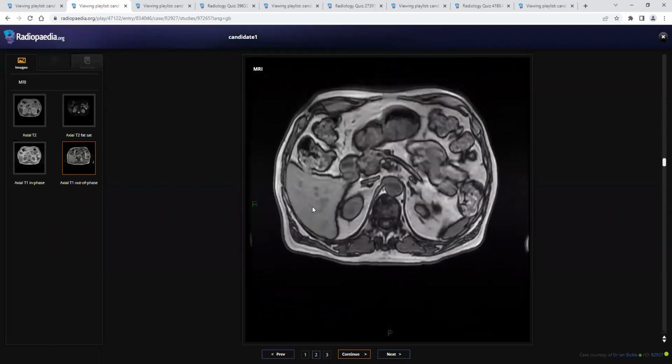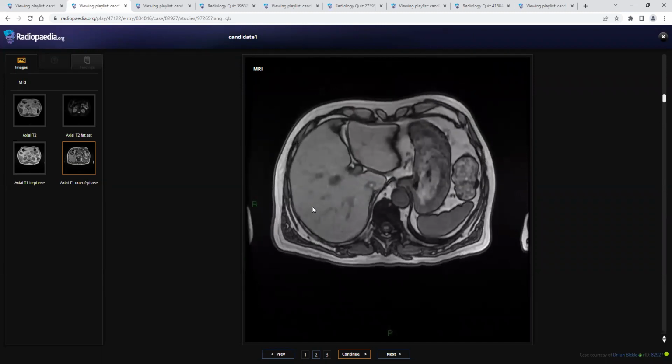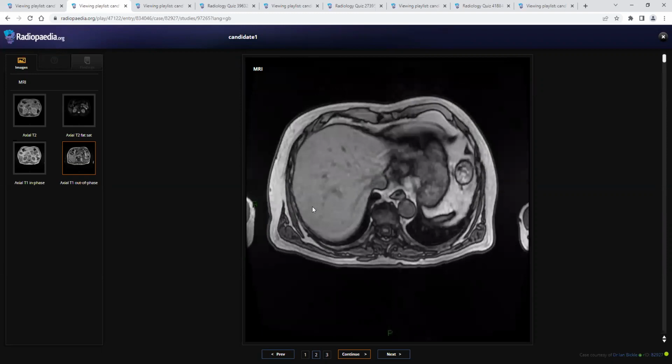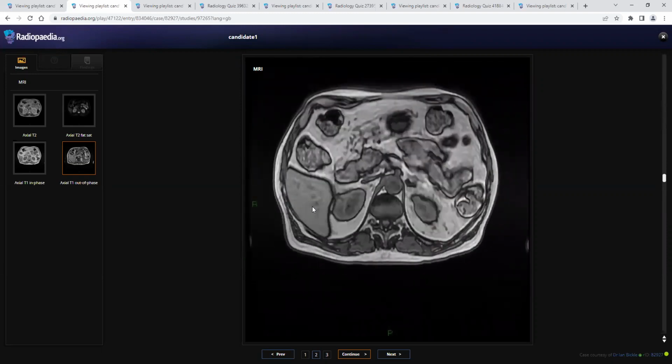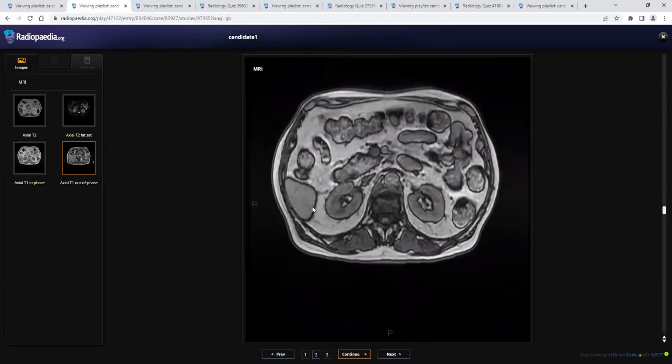And in my routine practice, I would compare these findings with contrast enhanced T1, and we may arrange for CT adrenal protocol, although these findings are going with adrenal adenoma. Okay, CT contrast adrenal study was not performed because of high creatinine levels of the patient, and this is the study we were able to obtain from the patient.